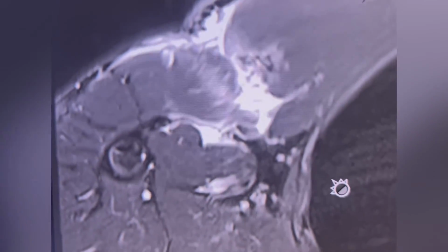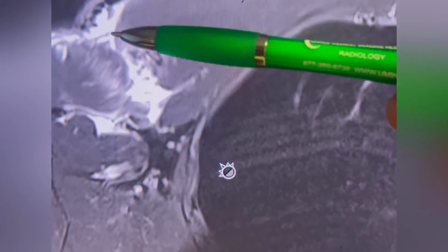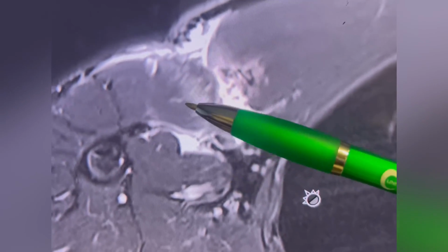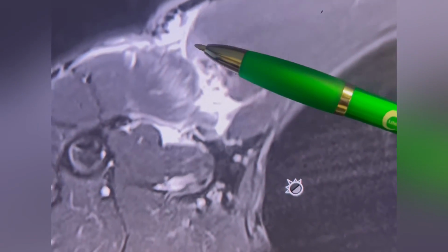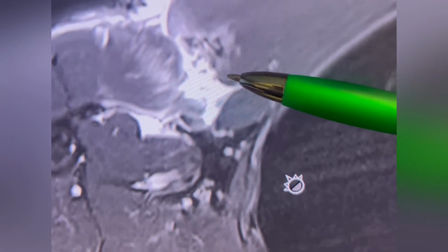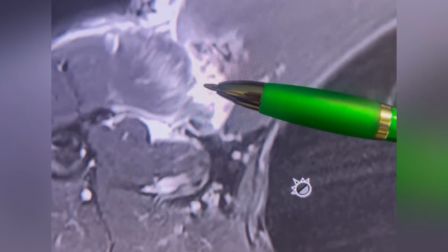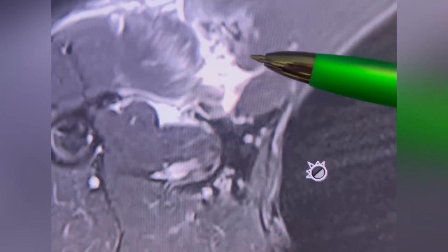We're looking at a cross-section or axial image here as though the patient is lying down. So this is the right chest as though we're looking from the feet towards the head, top of the chest. This is the lung field right over here. Anterior deltoid. This is anterior deltoid, and this is the pec right here. So you can see this big tear right over here, lots of blood. Usually myotendinous tears lead to a lot of bleeding, especially bleeding on the upper arm and the chest.